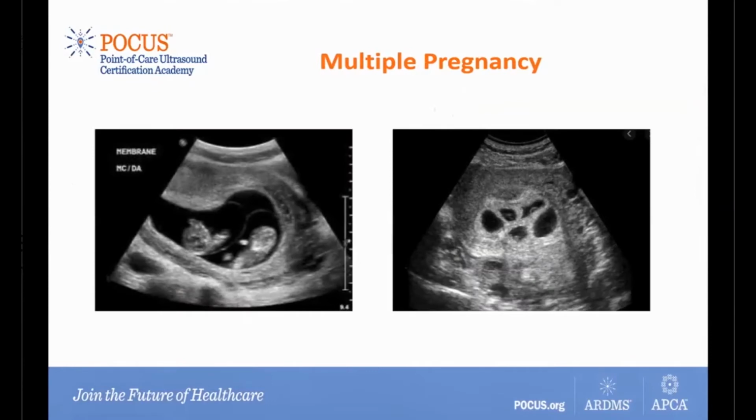The first trimester is also a very good time to determine if the patient has multiple pregnancy. It would be much easier, especially if you have a patient coming at third trimester and they've never had an ultrasound done. That becomes very, very difficult at times, especially if it's more than 2, 3, 4. So here we have a good example. You can see twins over here. And on this other side, we can actually see multiple gestation sacs, and it needs to be determined further down as the pregnancy advances to see how many embryos are present.